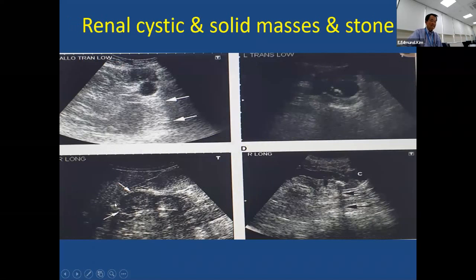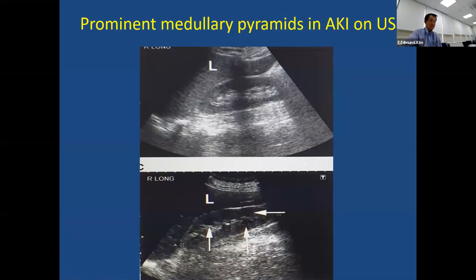And so there's a lot: cystic, solid, some stones with post-acoustic shadow, right? If there's a stone. So ultrasound is useful for evaluating stones and cysts, but again, ultrasound evaluation is all dependent on the individual operator. The transducer operator makes all the difference.